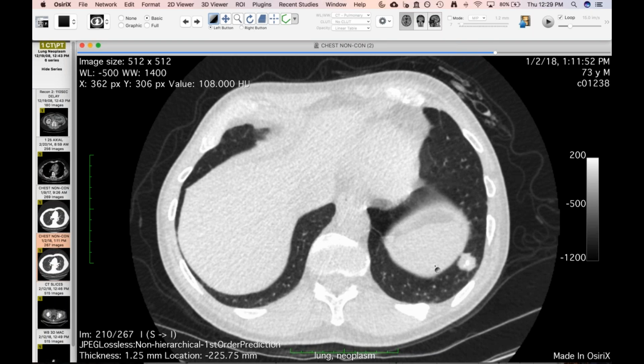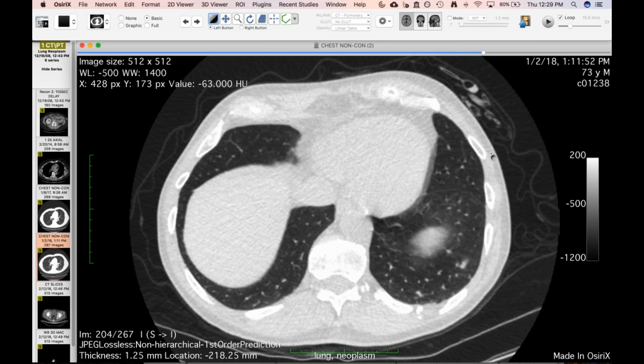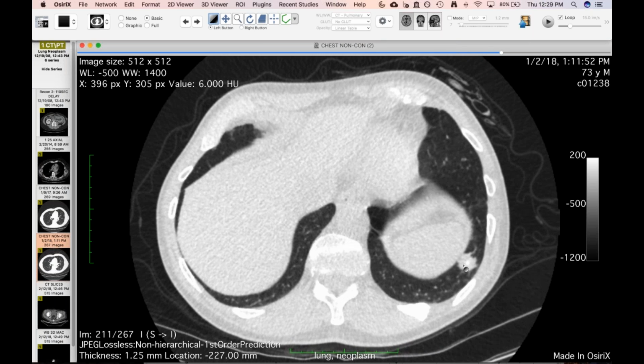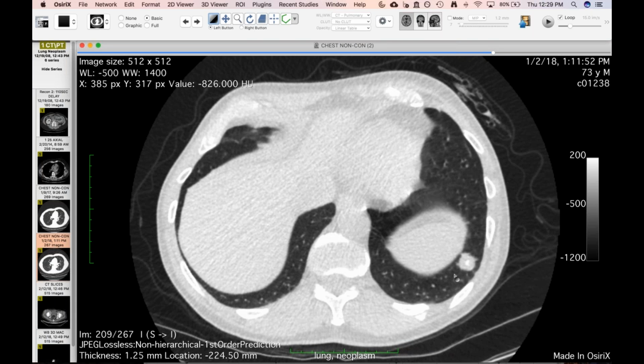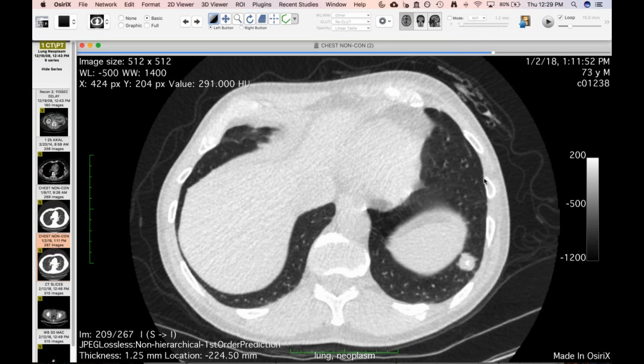Did they comment on that one? Bone? No, I didn't look recently. I don't remember. That's a good point though. Yeah, you're right. It's usually bone, and then you can have cysts even. Of course, what we often see with amyloid. But yeah, this was the only location. So a solitary amyloidoma. So just more of a curiosity than anything else.